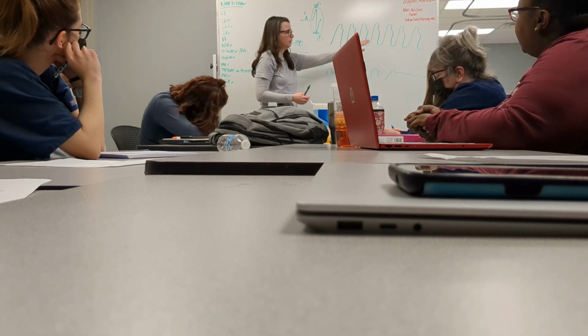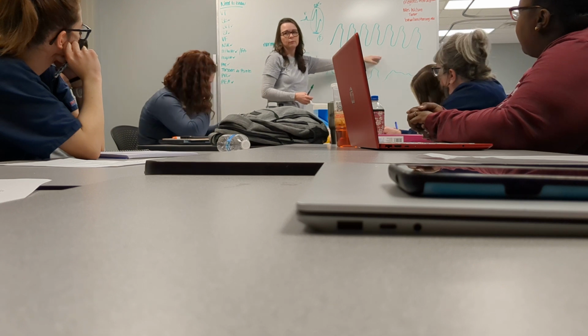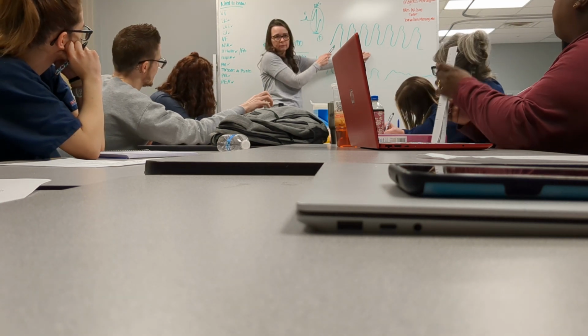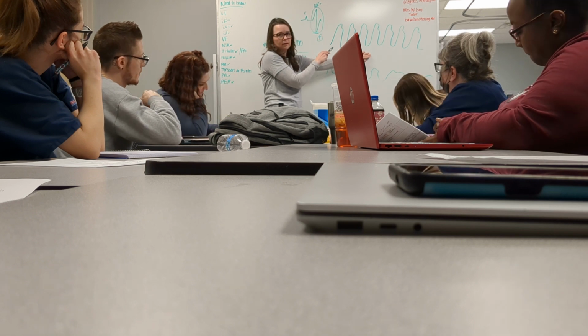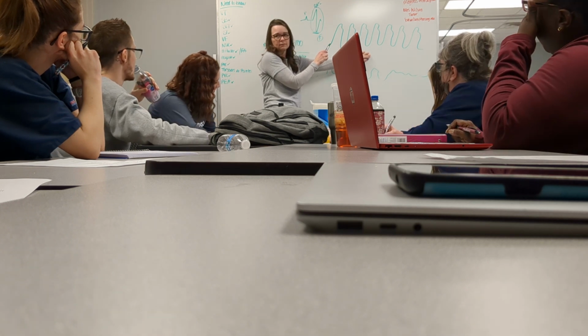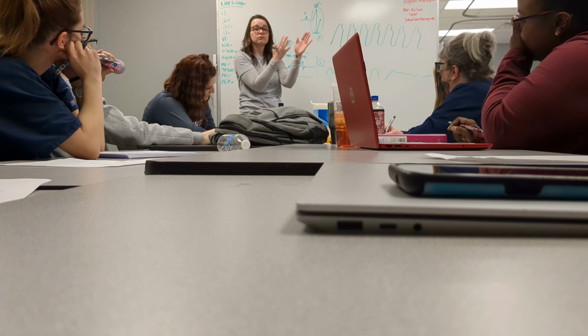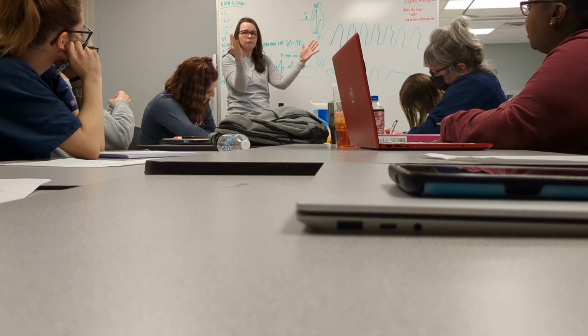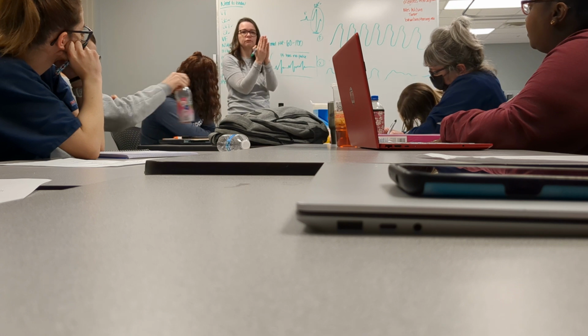Ventricular tachycardia. The ventricle is going real fast. Is this a fatal rhythm? Can be. You can live a hot minute in this because the bottom of your heart's going real fast, right? So the bottom of your heart's still pumping, but it's pumping so fast that it's not pumping a volume out.